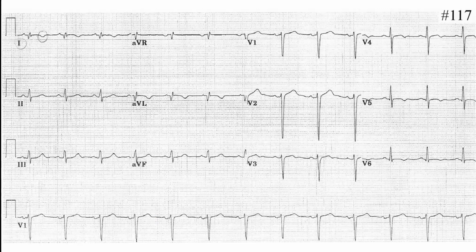Okay, looks regular. Yeah, that's regular. Let's say around 75 beats per minute. Very good. Go on. P wave morphology is upright where it should be and negative in AVR, so let's say it's sinus. Very good. Axis: lead 1 is equiphasic, so it's more towards the AVF. So it's around 90.